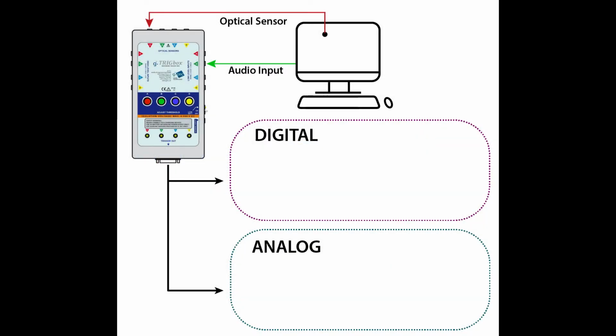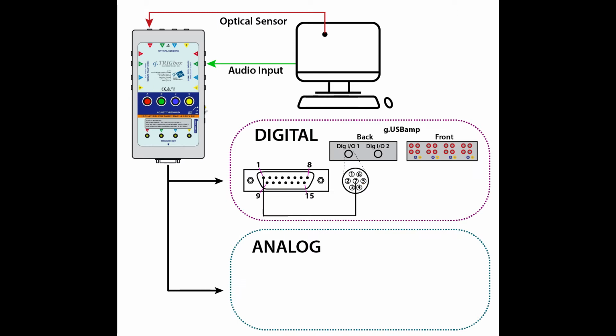It's important to connect the hardware correctly to measure the system latency. In this tutorial, we demonstrate the use of both digital and analog input, although using all digital or all analog input is recommended. Connecting the triggered auditory and visual stimuli to the digital input on the amplifier can be done using a standard cable from G-Tech. Here we show the pins that describe this connection.